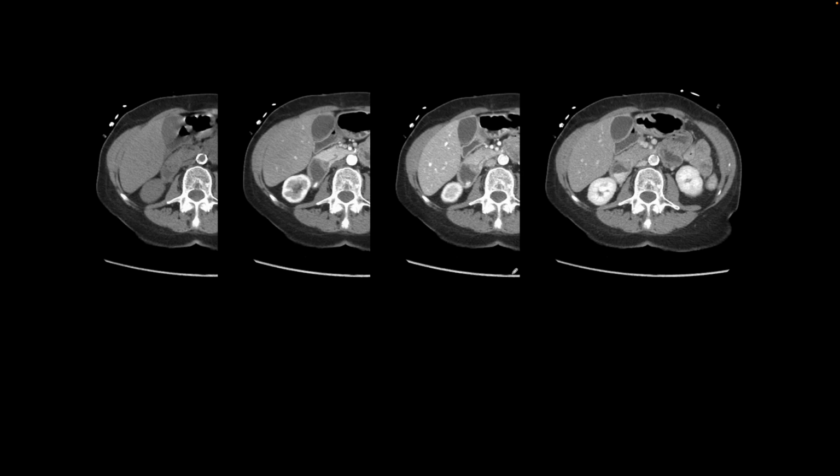This is our next patient. They presented with a history of GI bleed. We performed a multiphasic scan, the bleeding scan, so non-con, arterial phase, portal venous, and delayed. Pay attention here to the second portion of the duodenum. That looks normal right there. And then here on the arterial phase, we see contrast extravasation. That becomes more intense on slightly more delayed phase. And on the further delayed phase, we see more blood in the duodenum with a fluid level.